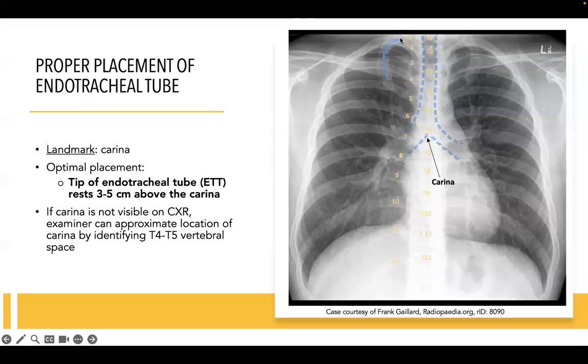This is the first rib here in blue. The first rib is C-shaped and appears much shorter and more vertical compared to other ribs. The first rib connects to the first thoracic vertebrae.